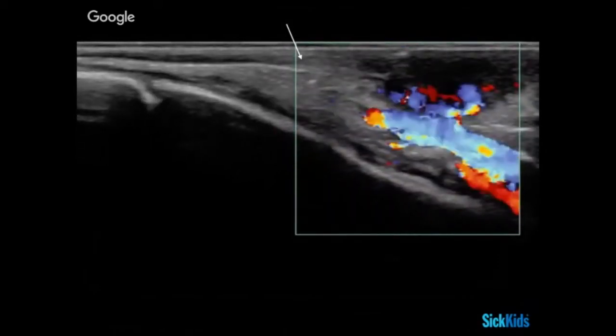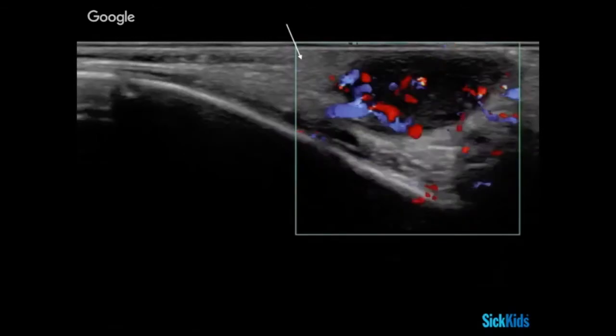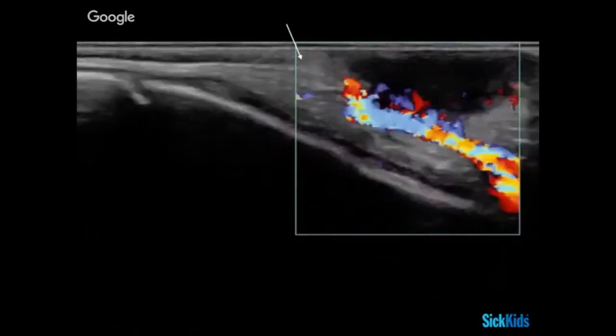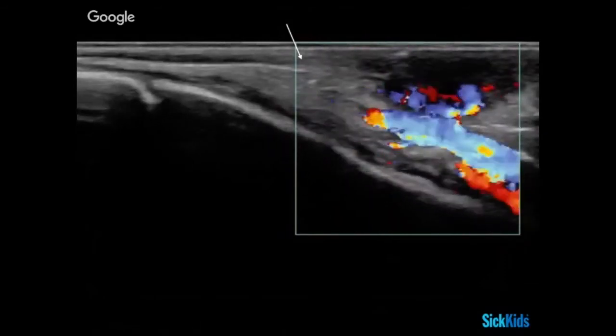Yeah, but it's not coming all the way up. Like, good thoughts, but I think it's not coming all the way into it. And an aneurysm would have flow through all of it. Even if it's a bit thrombotic? If it was thrombotic, then potentially no. This clinically was an abscess. No, but definitely good thought.